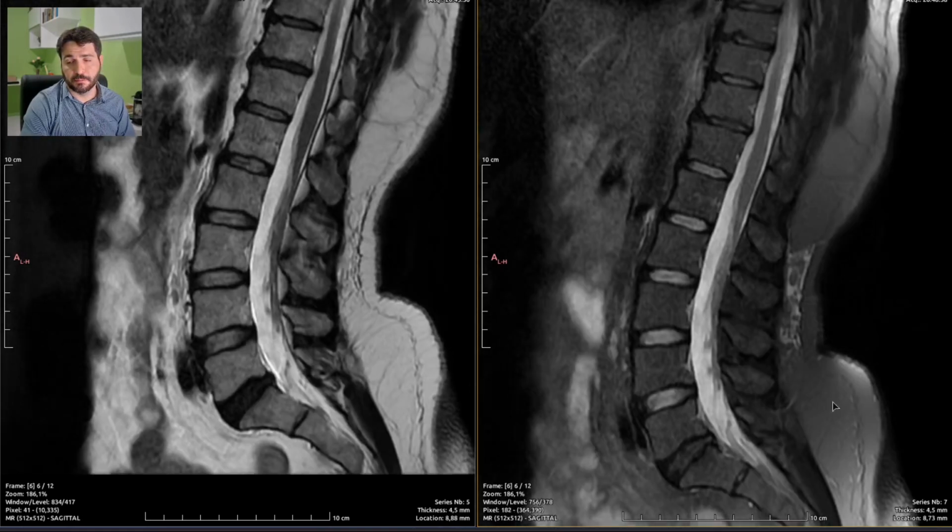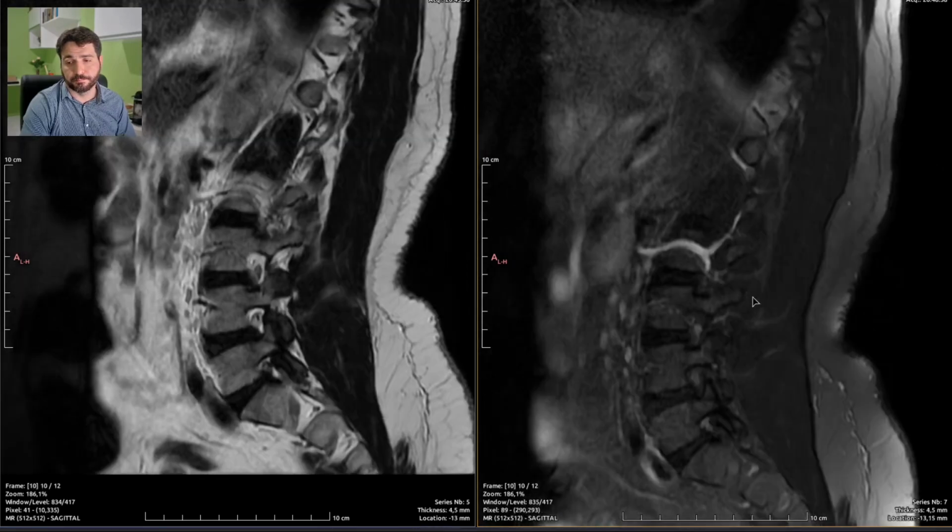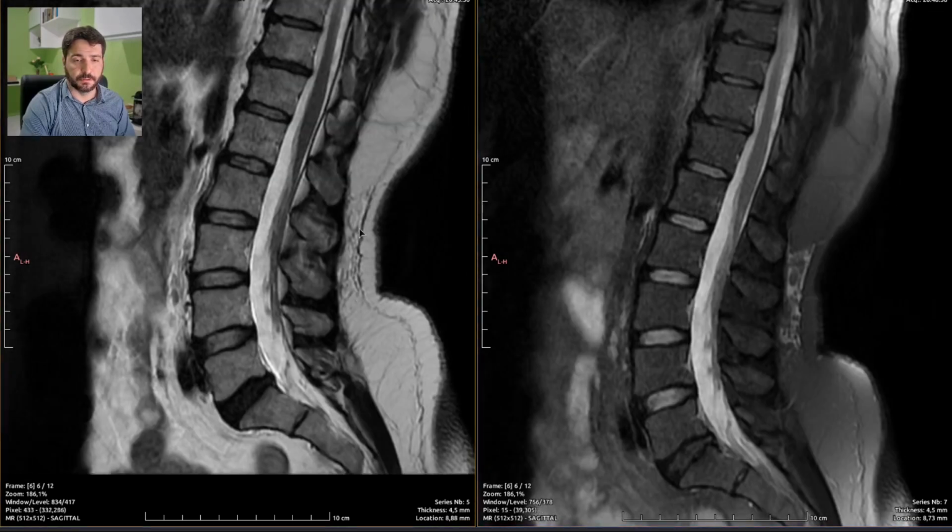So this isn't really an issue. This isn't related to the disease we are reporting. So this doesn't need to be reported. This is just a regular thing we see on almost all patients in this setting. So this isn't disease, we are not reporting it.